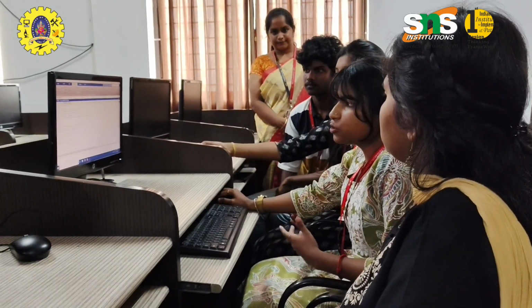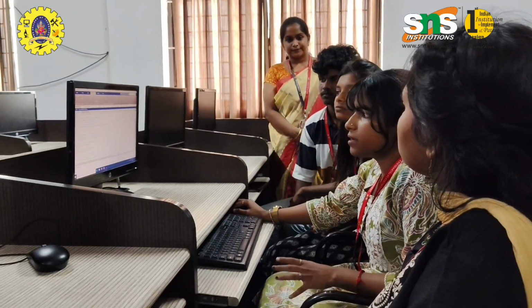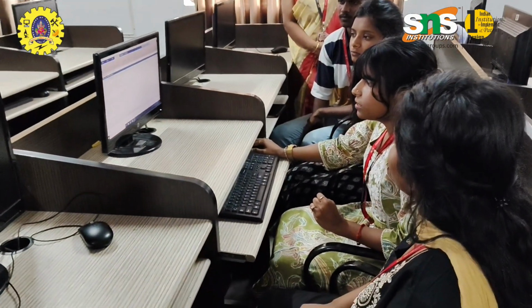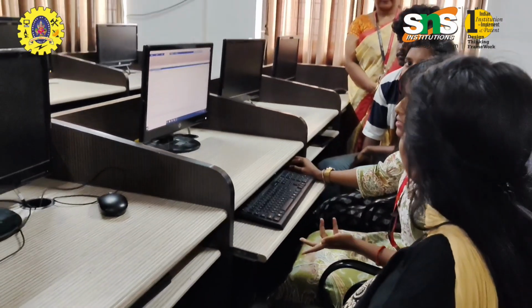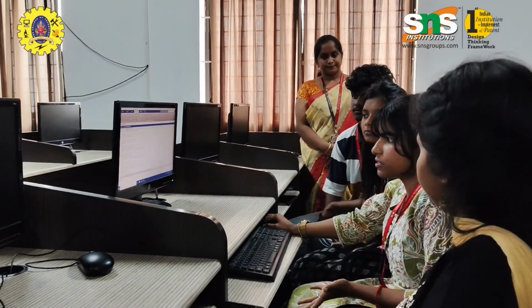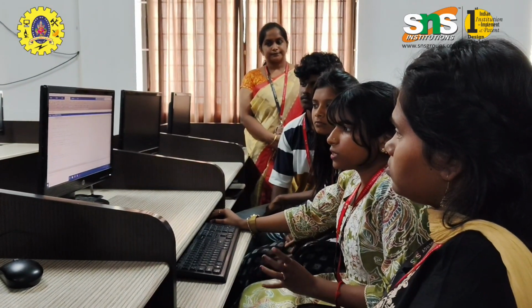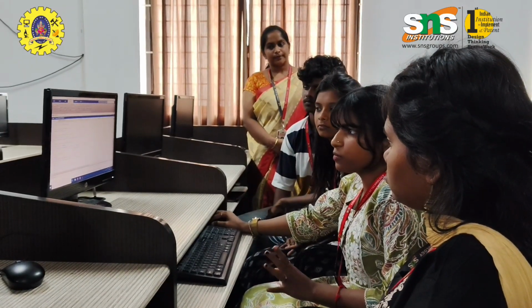Then our next step here is to filter the required frequency to remove noise. We are going to use a band pass filter here to get an ECG signal with frequency ranging from 0.5 to 40 hertz, and then we are going to process it using derivation and squaring, so that we can remove any unrequired noises and artifacts from the ECG signal. Then we are going to threshold it so that the QRS will stand out from the produced ECG signal, and then plot lines which make the QRS peak stand out from the produced output.